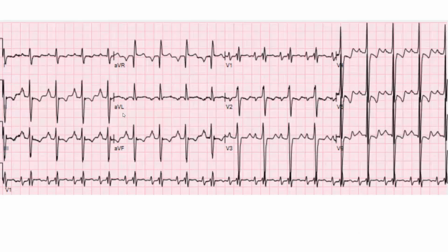Okay, I'll move on to this EKG. Can anybody tell me what's the diagnosis on this EKG? We have LVH by voltage criteria. You have the Sokolow-Lyon criteria: S in V1 plus R in V5 or V6 way over 35 millimeters, mainly met because of V5 and V6.